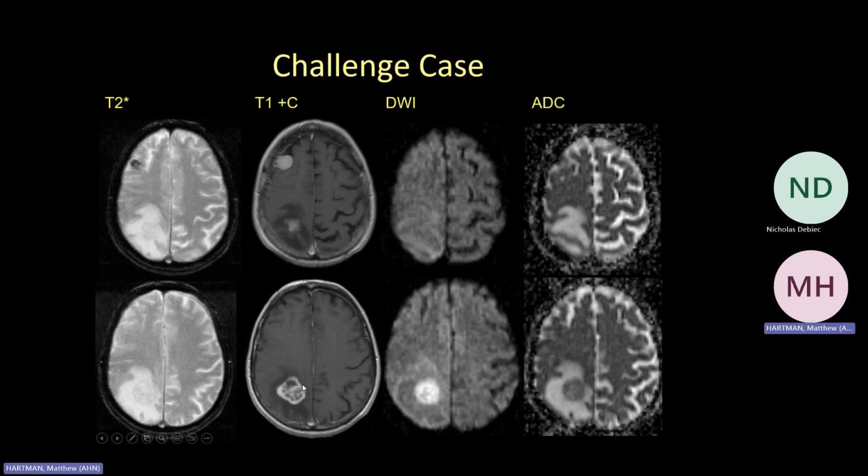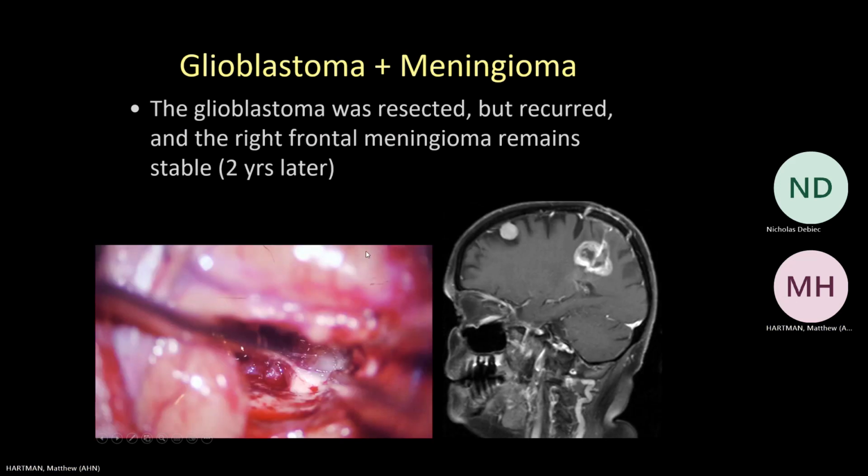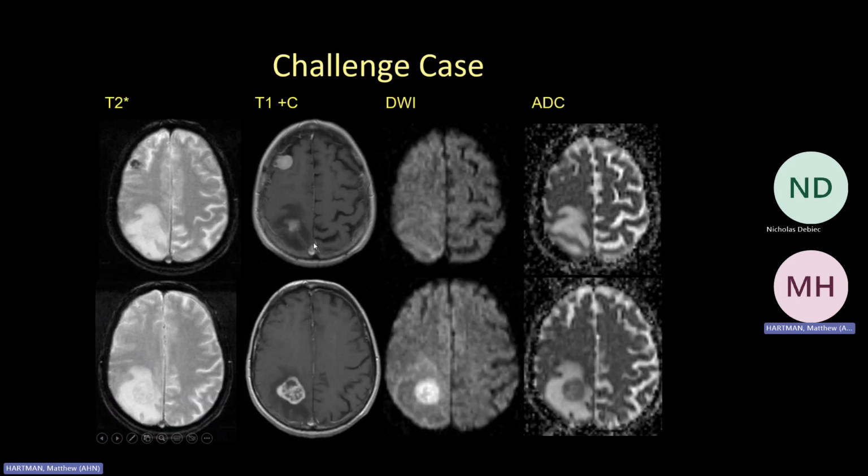And then we get some contrast. And we're seeing a couple of things. I'll give you guys a couple of seconds. And you can pause it, you can go back and forth. I'm going to keep going. And say this was a twofer. There was a GBM with a meningioma with our extraaxial lesion there, and then a more infiltrative, sorry about that, intraaxial mass, and so there's our meningioma. There's our GBM. So twofer.